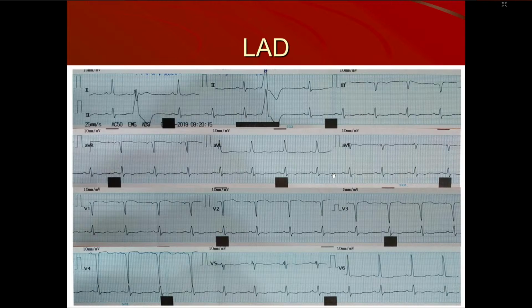I couldn't bypass any of these ECGs because they are very interesting and very important ECGs. So it shouldn't hurt to go through these findings again because this is what you will get in the exams, and these are the findings, and you will get these only. So the ECG might change, the patient might change. That shouldn't bother you because by then you will be masters in ECG and you will be able to detect.